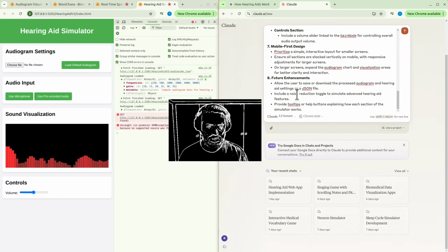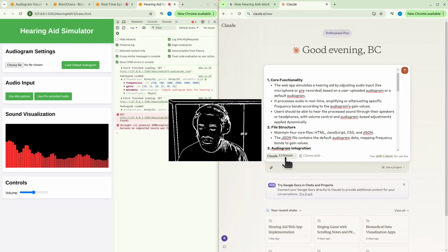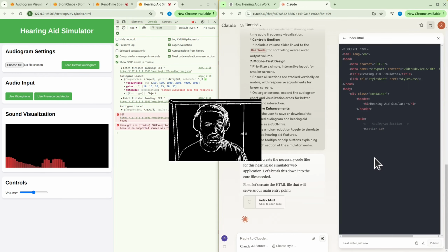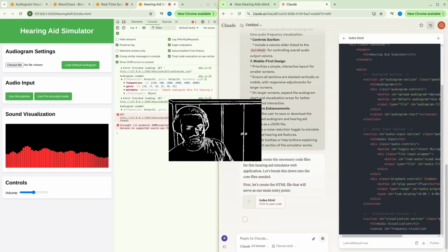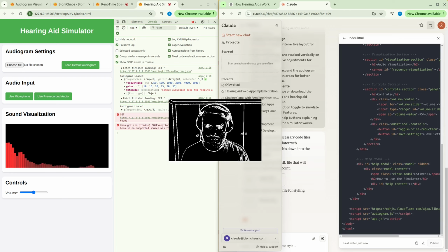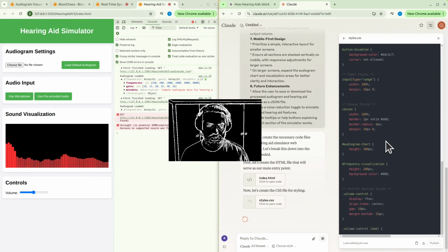Yeah, don't worry about future things, but I'm not that familiar with Claude actually. Assuming it's okay to use 3.5 Sonnet. That's the default. Yep. Okay, index HTML. This will be a 6th or 7th version of this hearing aid simulator.